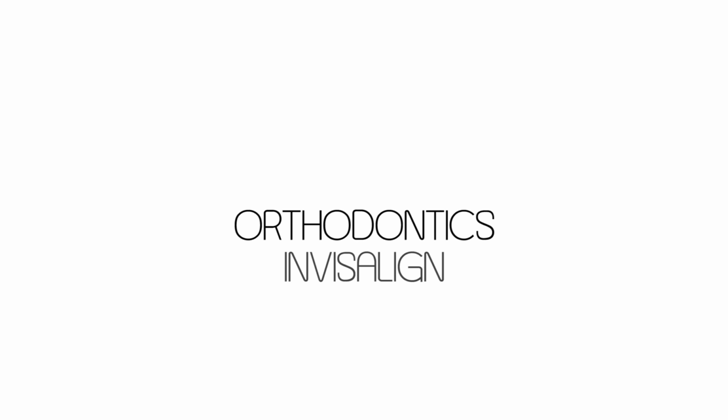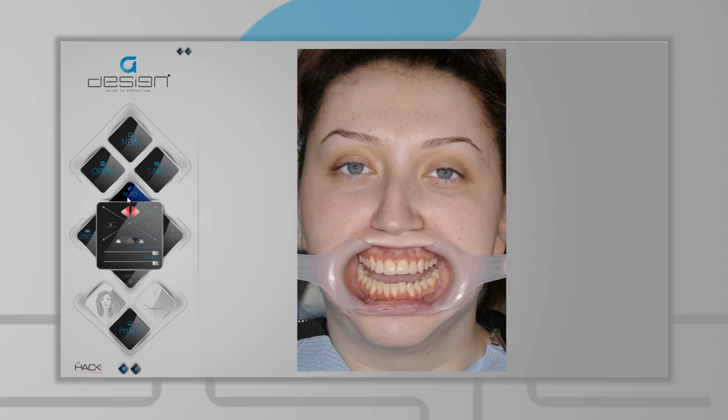Orthodontics, Invisalign. G-Design can also be used to verify the orthodontic layout in relation to the facial axes.